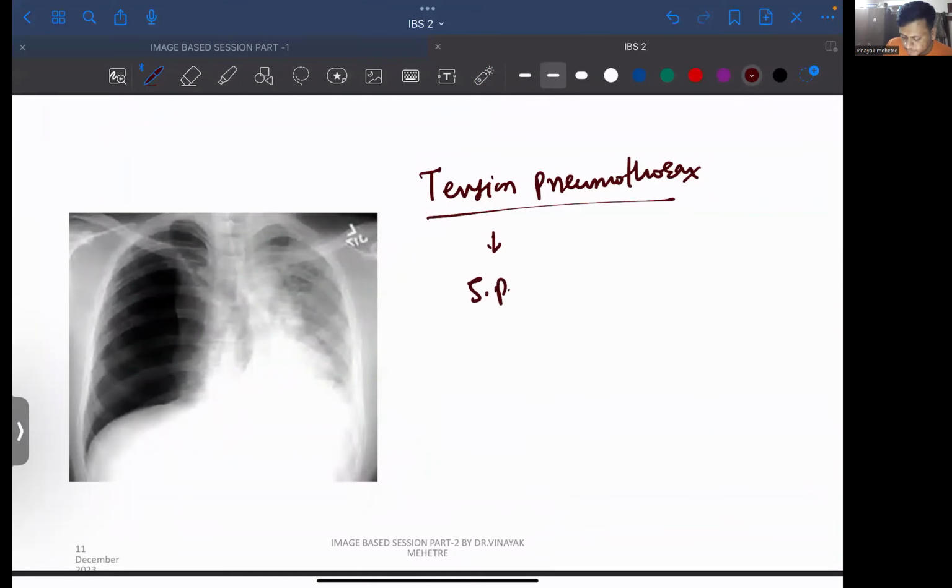Same simple pneumothorax के features मिलेंगे, right? CP angle is going deep, deep sulcus sign, absent bronchovascular markings, है ना, विसरा और प्लूरा के बीच में clear line आ चुकी है. Trachea is shifted, it should be over here, but क्या हुआ? Tracheal ring is shifted. So does our heart. Right border, है ना, along the spine होती है ना, यहाँ पर होनी चाहिए right border. It has shifted to the left side. So this is called tension pneumothorax. क्या मिल रहा है इसमें? Mediastinal shift.